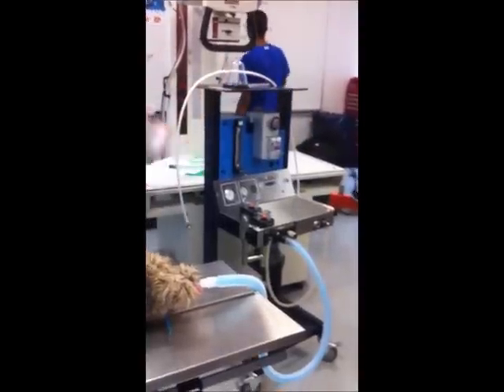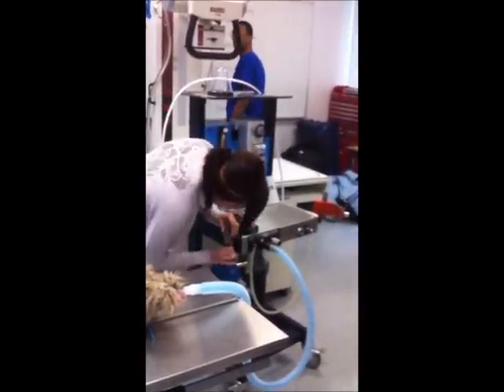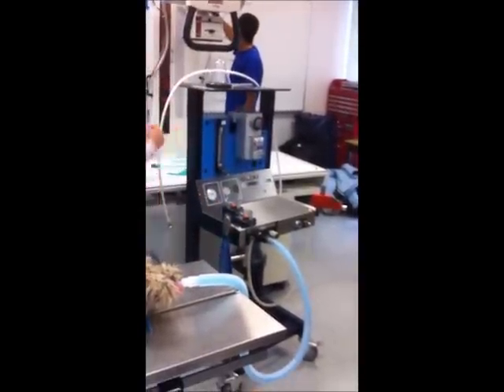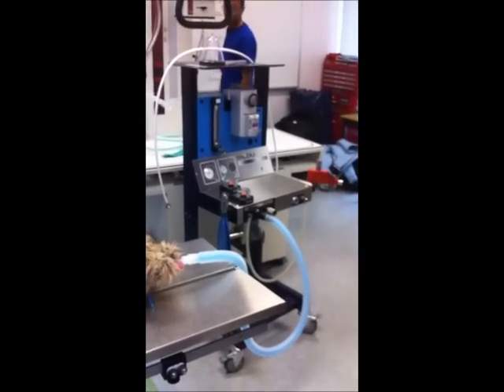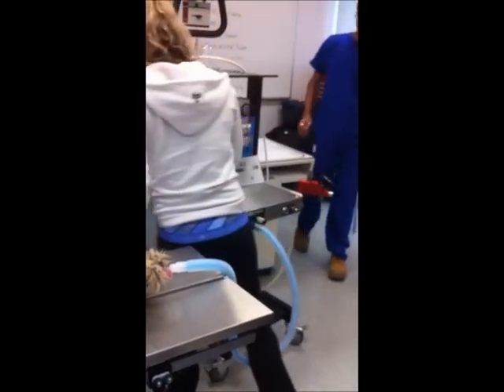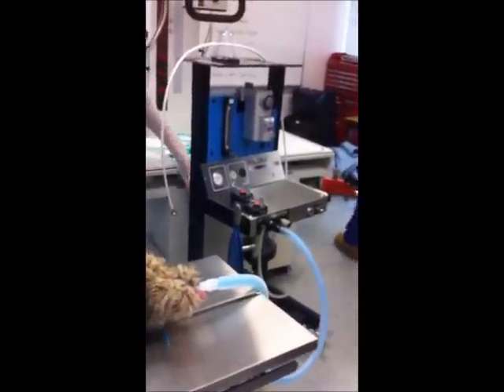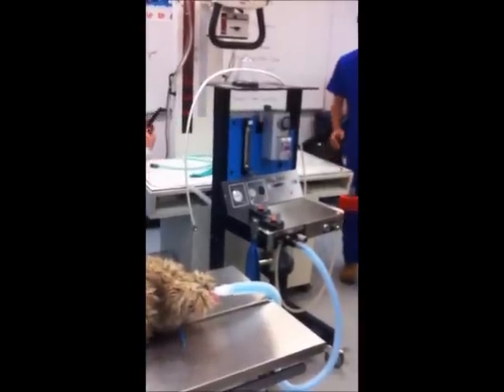Okay. So that goes somewhere. There, yeah. And then you do the scavenger one. Yeah. I don't know where it goes though. There's one at the back. Which side? Doesn't matter. Yes, it's the same. Oh, here. Move it out of the way. You guys mind turning that to the side for the rest of us?